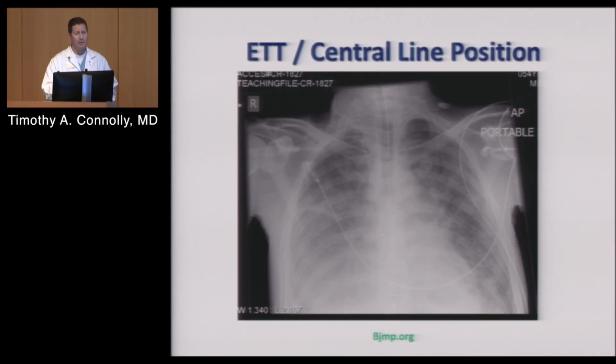So talking about the hand of man. When we look at X-rays and when we get a daily X-ray on somebody in the intensive care unit, the main reason we're doing it is this. We want to make sure that the tip of the endotracheal tube hasn't migrated with them turning and the trip they took downstairs for CT, et cetera. You've got to make sure that isn't about to fall out and create a bad situation. You also want to make sure that lines are in the correct place. Sorry, I'm off angle a little bit. Going to there. So that shows the endotracheal tube for those of you who couldn't see it from the back.